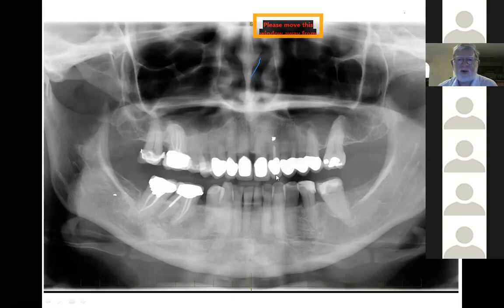You've got a post in there, you've got a crown. There will have been pathology. A flap will have been raised and an apicectomy done, and then a retrograde amalgam placed in the tip of the root there. And there's the periapical pathology on the 2.5. Those are okay. We'll go on to the next picture.